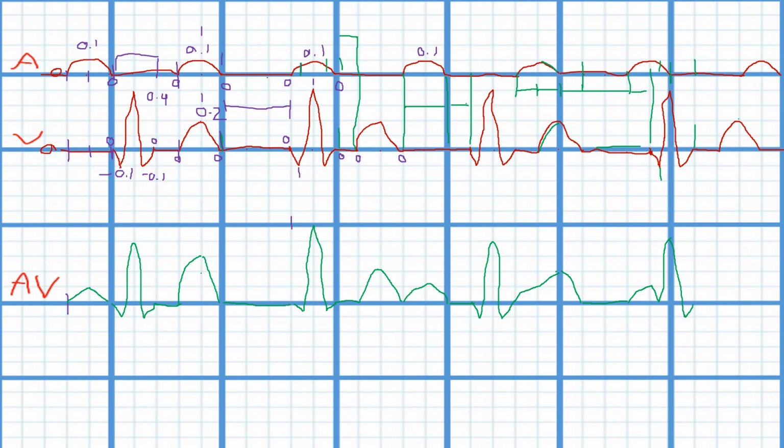All right, now the atria doesn't have anything going on, but the ventricles do. So right here, here's our baseline, 0, nothing's going on, a flat line. Now we just copy what's going on in the ventricles, this section right here, because that's the only thing happening. All right, and so that's what you've got right there.